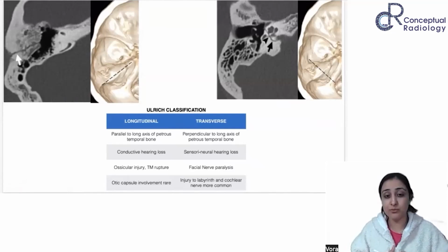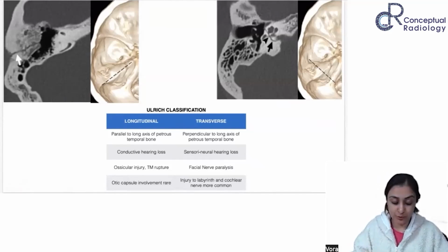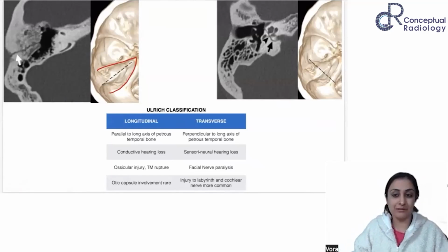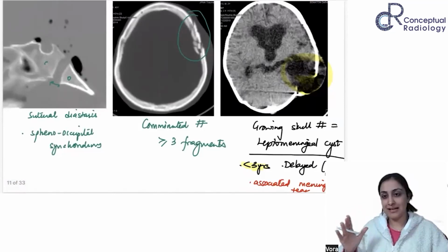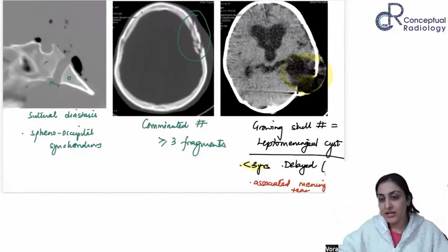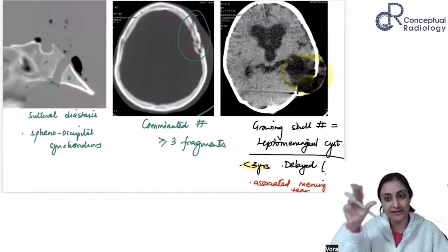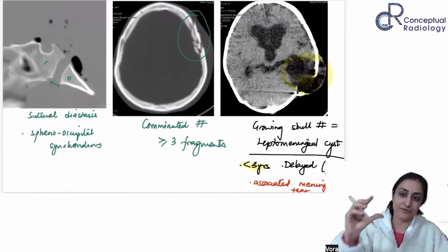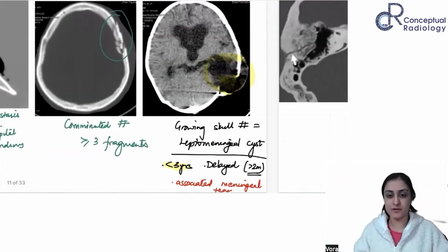Talking about temporal bone fractures, just to finish this off, we will be having temporal bone anatomy and pathology sessions. But now talking about temporal bone fracture. So this is the repeat of growing skull fracture. In one line, it is a delayed complication of a fracture in younger children. The associated dura and arachnoid tear with the fracture, which results in the herniation of CSF outside, forming a cyst which does not allow the fracture to heal. Okay, so this is about growing skull fracture.